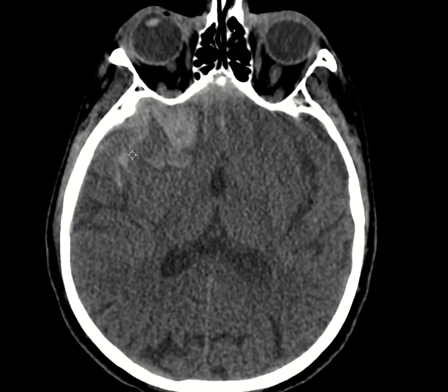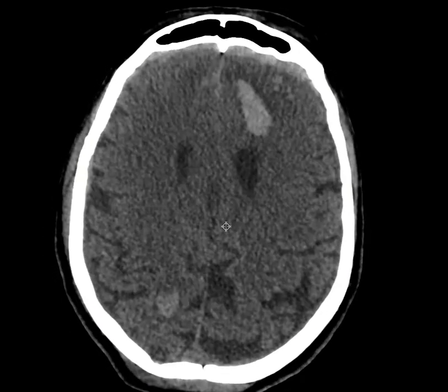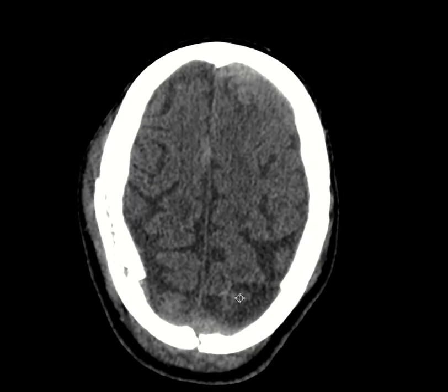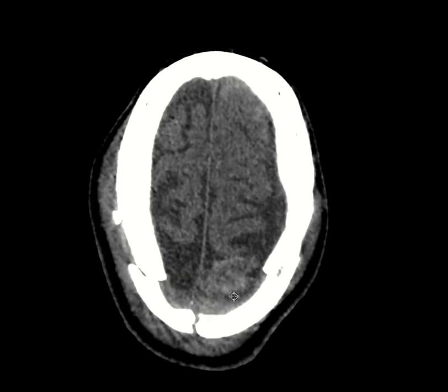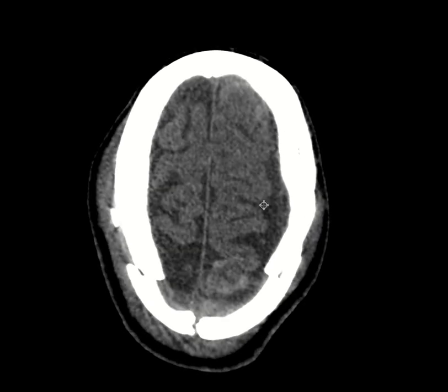So there are some areas of subarachnoid hemorrhage. As you see, these are all subarachnoid hemorrhage about the gyri recti bilaterally. And so it's not unexpected. The patient has a very severe traumatic injury, and we have different types of parenchymal hemorrhages and subarachnoid hemorrhages. You see that the subarachnoid hemorrhage usually is along the sulci and cisterns. So these are the sulci. You see that these hyperdense linear areas are in the sulci.